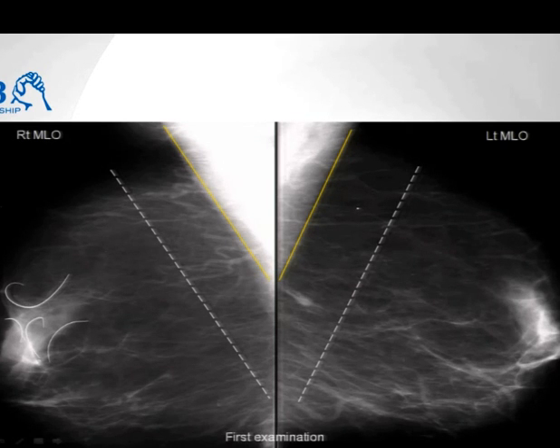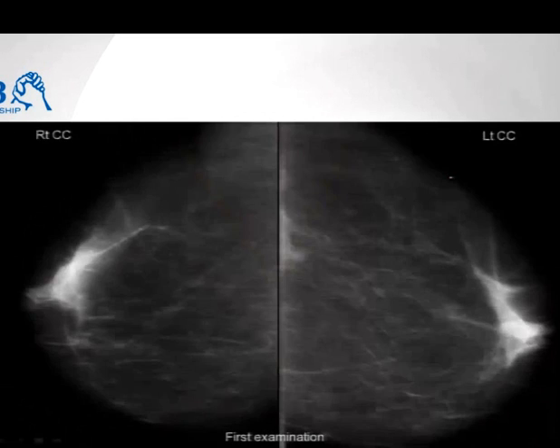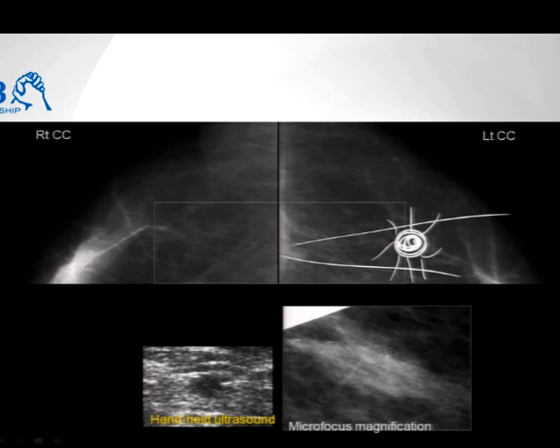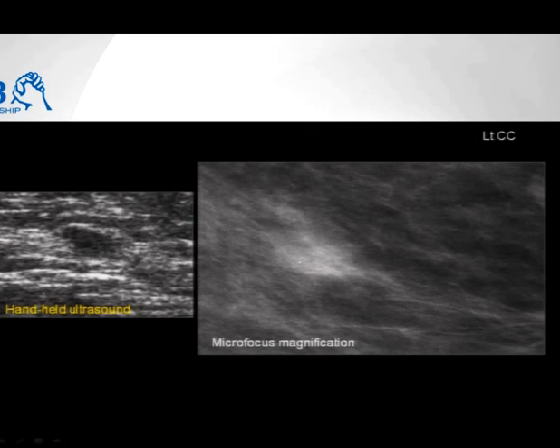It's a non-specific asymmetric density because I tried to find TDLUs and ducts in it, and there aren't any, and because it's convex, and because it's in the wrong place. You are going to hear immediately 61% of the cancers are here. So this is clearly a callback case. Even if it doesn't look like cancer, you know that the baby phase of the cancer is a non-specific asymmetric density. If you let it grow a little bit, then it becomes a very clear malignant lesion, and now you know that this is a cancer.